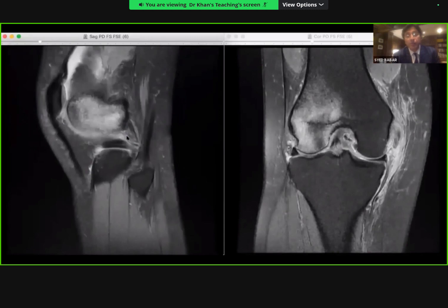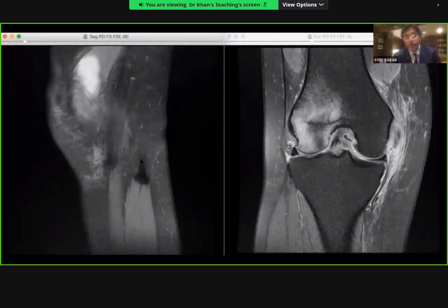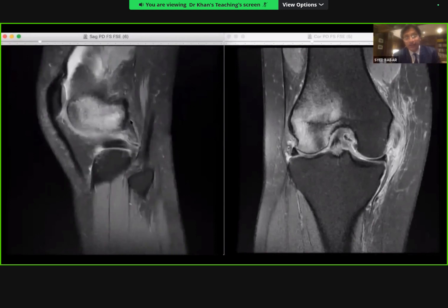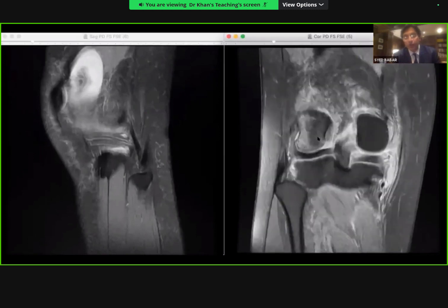When I start with my routine, remember I said I start with the lateral collateral ligament conjoint. Now here's your lateral collateral ligament. You can see it beautifully here, coming at an angle, joining the biceps femoris, forming the conjoint insertion. So actually the first sagittal gives you a beautiful view of the lateral collateral ligament. Now let's just confirm the lateral before we go anywhere.